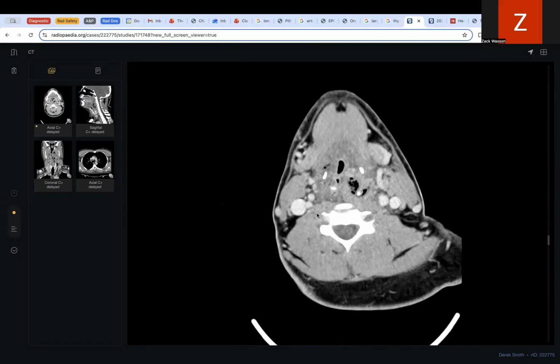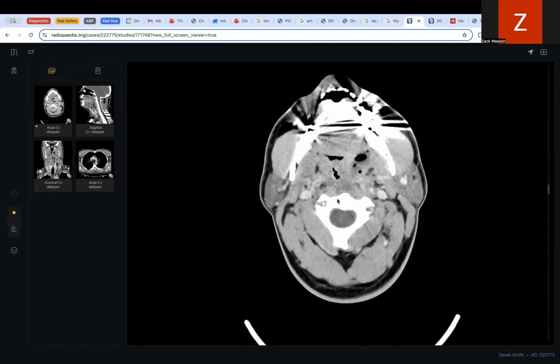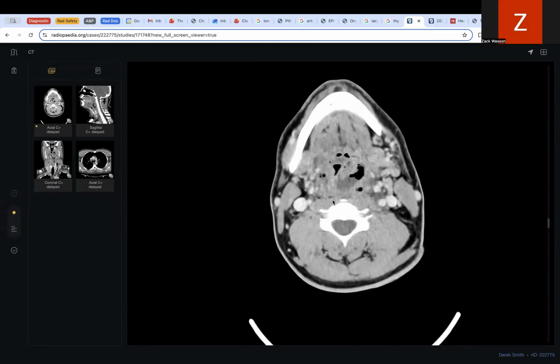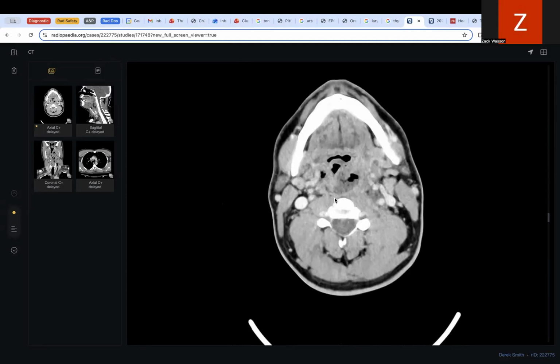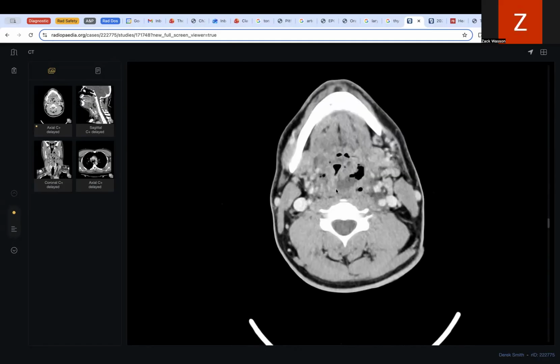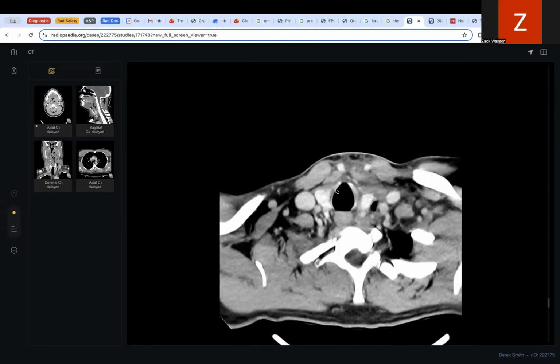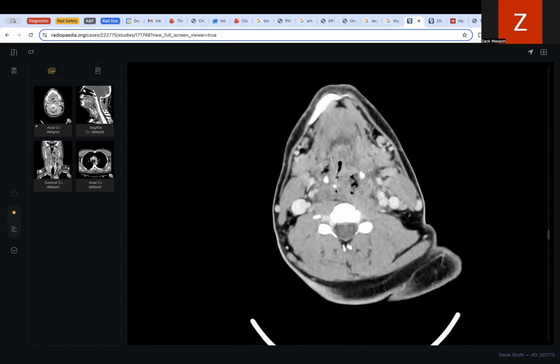Those are very important. And as you can see, there might be a contrast agent in here as well because of how white that is. Contrast agents are used to attenuate photons, just like a high attenuating material would, like a bone. So we can see angiography. You can see how those vessels are actually moving blood through.